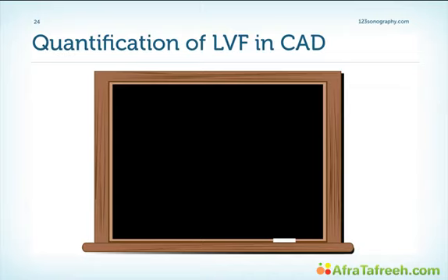Quantification of left ventricular function is especially difficult in patients with coronary artery disease because you have to account for regional wall motion abnormalities. But in principle, you can use the following methods. The Simpson method. However, when you perform the Simpson method, you have to be aware that you're doing that in a 4-chamber view, and if you also do the biplane method, in a 2-chamber view. But you're not doing it in a 3-chamber view. Therefore, wall motion abnormalities seen in the 3-chamber view, in other words, the posterolateral region and the anterior septum, are not included in this calculation. So you can over or underestimate left ventricular function based on where the regional wall motion abnormalities are.